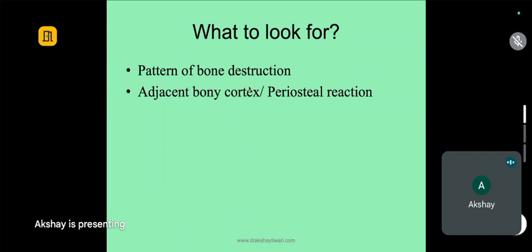Cortex में क्या देखोगे? Cortex destroyed है कि नहीं है. ठीक है? And then Sir, how do we say it's a mineral cortex या फिर the different types of cortex? Yeah. So वो cortex नहीं है, वो matrix है जो आप कह रहे हो. Yes. Right? Yes. Cortex तो bone का cortex है जो host cortex है. Matrix is what the tumor is producing, the third here. तो matrix है जो tumor के substance में एक्सरे में दिखता है.